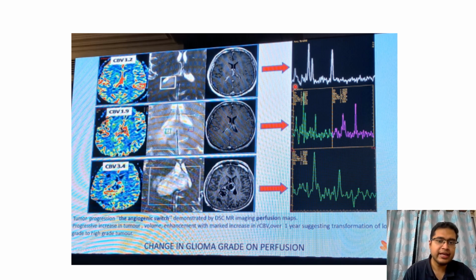This is my next case. Here we have a patient who presented with severe headache, and this is the MRI done for this patient. We can see an ill-defined hyperintense area on these T2 weighted images. Both on T2 and FLAIR, this hyperintense area was seen in the periventricular white matter in the right occipital region. On the post-contrast T1 weighted images, no significant enhancement was seen.